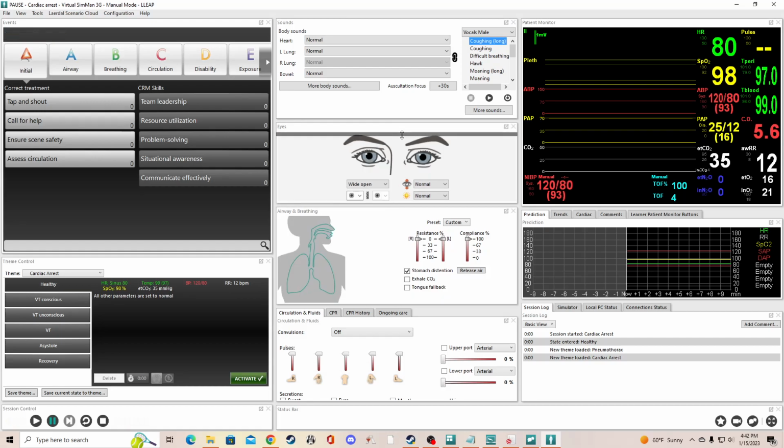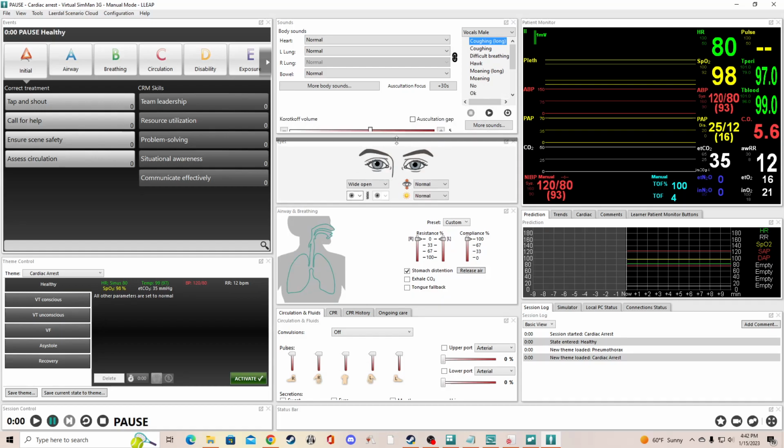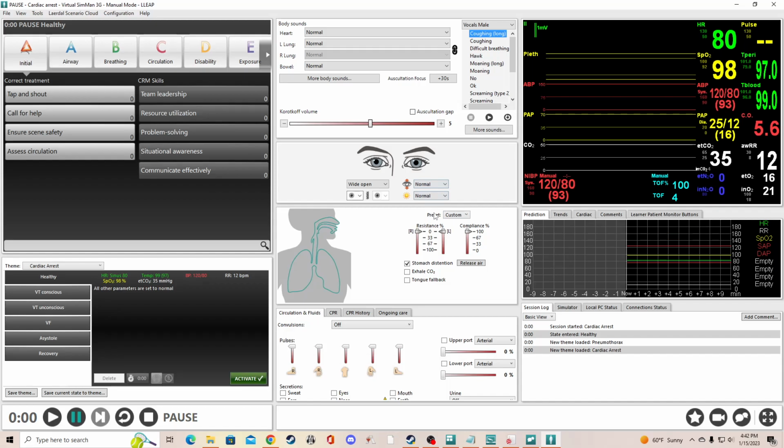So we're going to try to make eyes just smaller. We can make it even smaller. And then there you go, our Korotkov, I've been saying that wrong this whole time. Volume is now, so we got our slider back. All right, so that's just adjusting the view. And just know that you can do that with all this stuff.